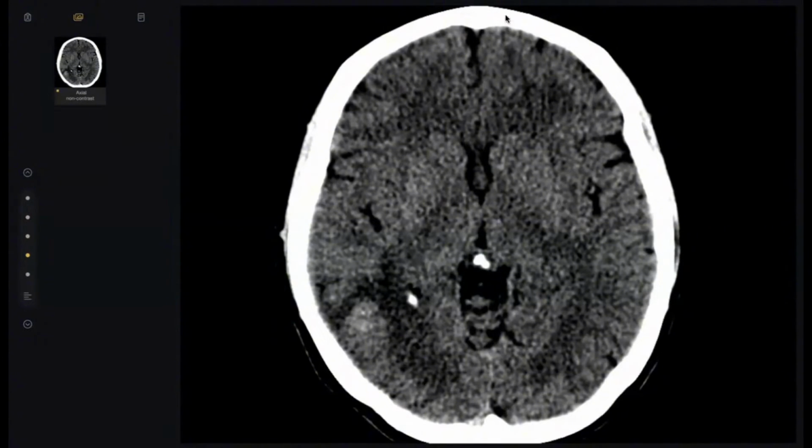This is a static image, sir, of the cerebral white matter. There is accentuation of the gray-white differentiation, more in the occipital lobe. Apart from that, I can see a linear area of hypodensity in the right parietal region with loss of gray-white differentiation, with an associated hyperdense area in the adjacent cortical region.